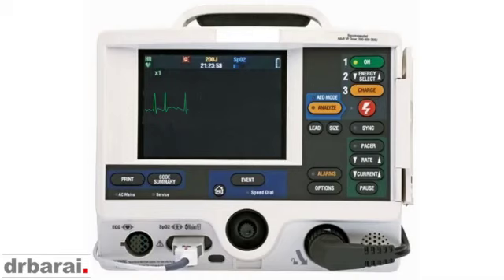We see this all the time. This was a 56-year-old gentleman who came with palpitation, and he did not have any known medical conditions. He does not take any medications either. And when we connected the patient to the defibrillator machine, we found this.